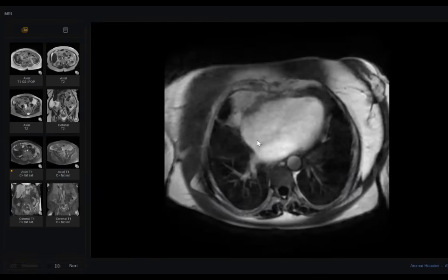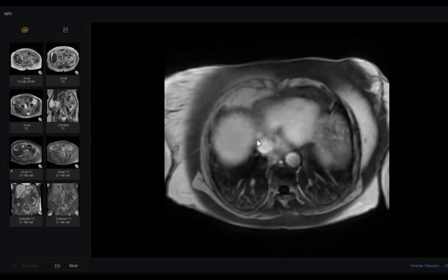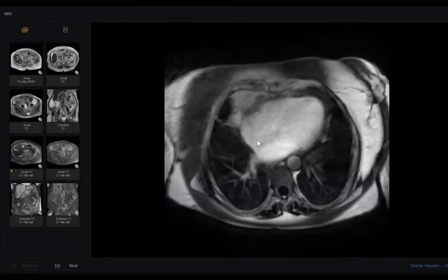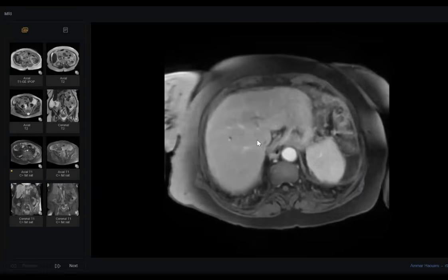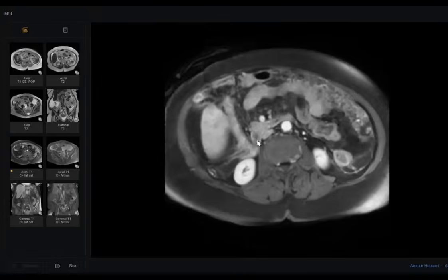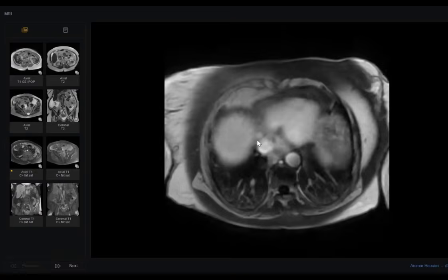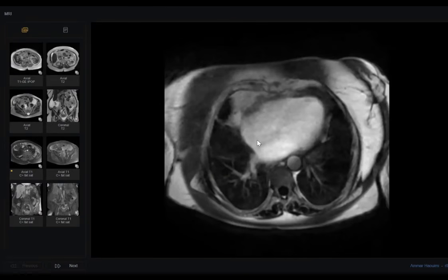So what's your diagnosis, doctor? Sir, there is peritoneal thickening with moderate abdominopelvic ascites. The most likely etiology I would be thinking of would be infectious, that can be a tuberculous etiology. The second thing I would be concerned about is a malignant cause, which I don't appreciate here. I don't appreciate any mass lesion actually. Is there any clue to differentiate between both of them?